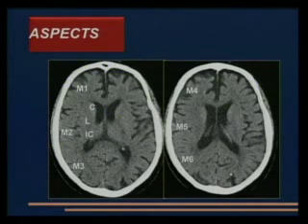So these are the territories for the ASPECTS. In every area of hypodensity, you decrease one number. So it's 10. If you have these 3 areas with hypodensity, you say, okay, this is a 7.